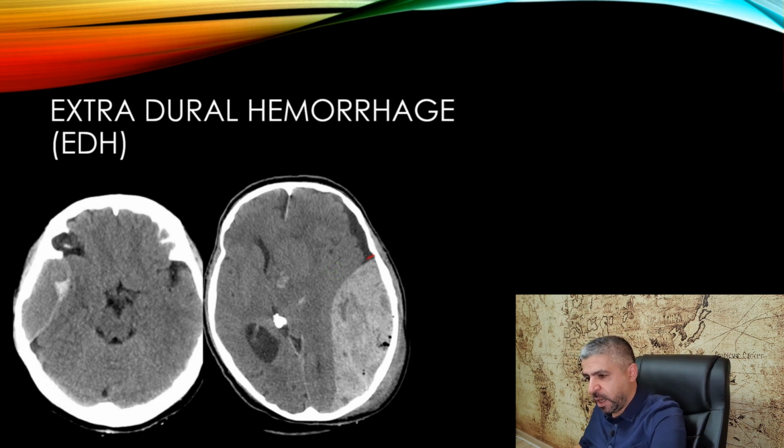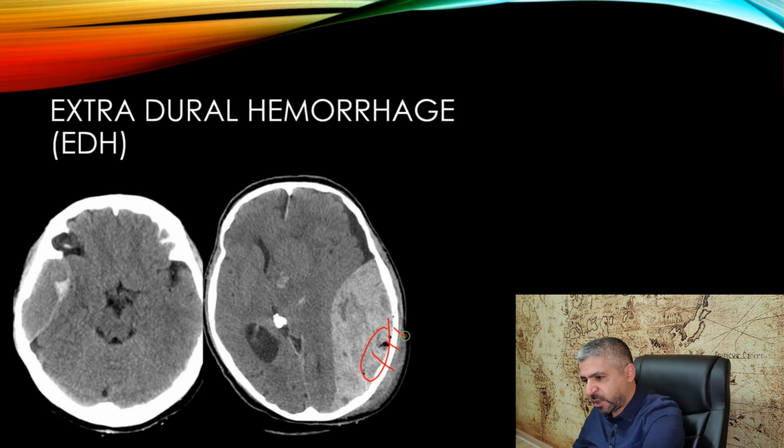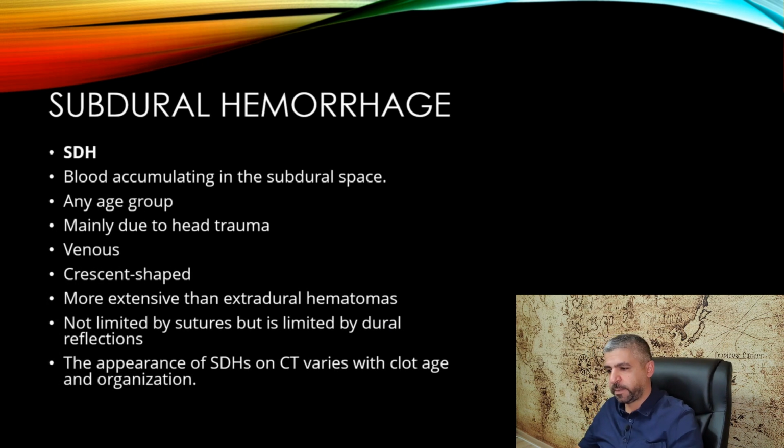What about this one? Here we can see a large epidural hematoma, okay, and you can see its density is high. The interesting feature here is we can see these tiny black dots, and these are, of course, air bubbles. So where would air come into the intracranial cavity? Simply because there is an associated fracture somewhere, and it's open to the skin and it's leaking air into the collection. So the presence of air bubbles will confirm an open skull fracture.